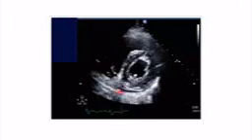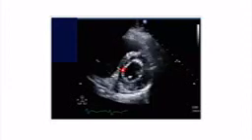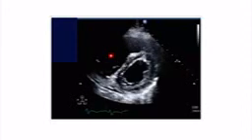Remember the paradoxical movement of the septum, which is moved towards the left ventricle, and it has a D-shape. When we look at these two echo images, immediately I think most of you will probably get the diagnosis correct. We've got definitely a right heart problem in the setting of a patient who has low oxygen saturation, which was probably falsely diagnosed with pneumonia. In addition, we see that there is some degree of pericardial effusion, and the pattern of motion of the septum clearly points to a right ventricular pressure problem.